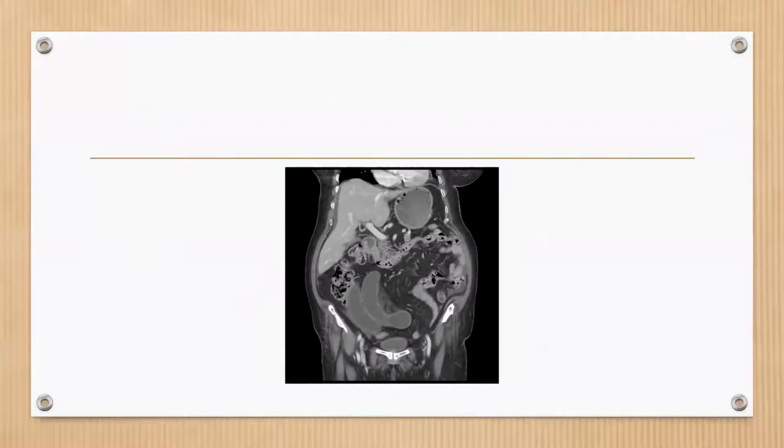So this image is for the CT scan. We can see here that the abdomen showed evidence of significantly dilated small bowel loops on the right side, and then in the lower abdomen and the pelvis, a short segment of critical stenosis measuring about 2.3 centimeters. It is also suggestive of internal herniation with dilated loops of the bowel, and the jejunal loop and the distal ileum appeared collapsed.